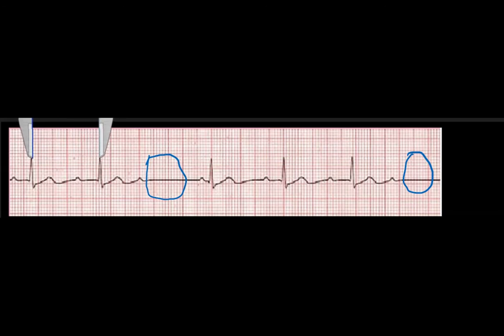So once in a while, we'll find EKGs that are kind of difficult to be able to tell, and we have to really measure out our QRS complexes. So we know that it is already irregular. So what we're looking at here is we're just going to help verify that, in fact, things are irregular. And here's where you see that there should be a QRS. There is not a QRS complex. And then when we come down here, you will notice that things here were okay, right? We're lining up, and there's another one that is missed.